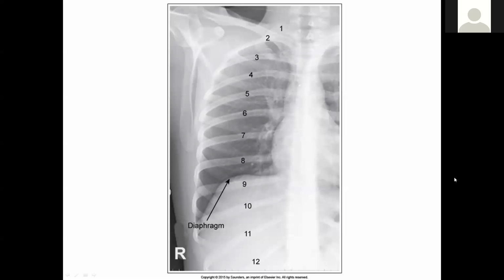Your rib should be exposed on full inspiration, which may be a little difficult for patients with rib injuries, but we need a good backdrop of air in the lungs as a visual contrast, which makes potential rib fractures stand out better, white against the black and the air in the lungs.